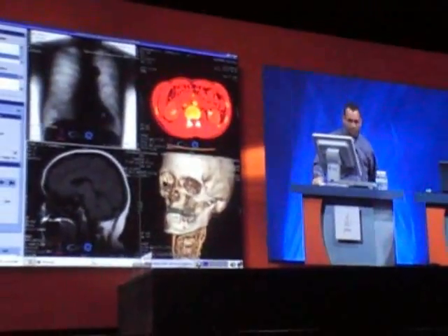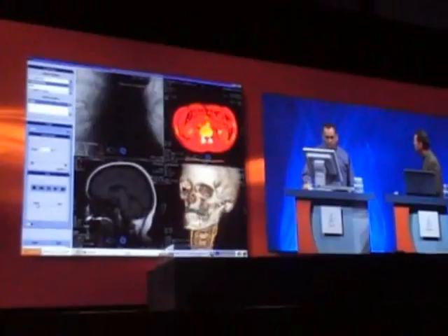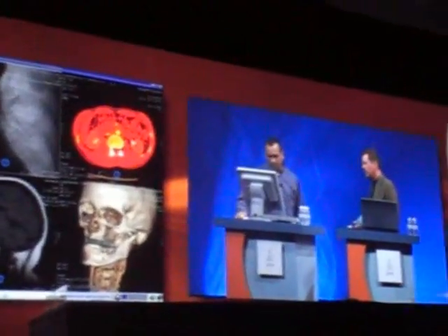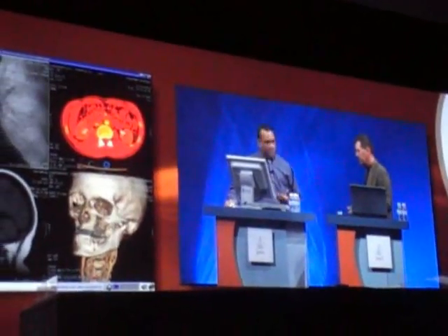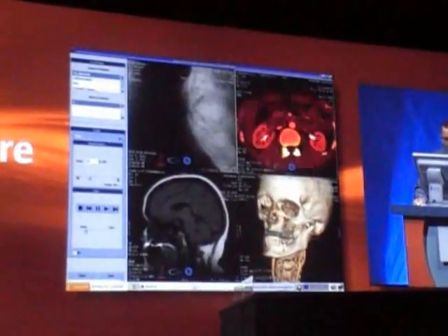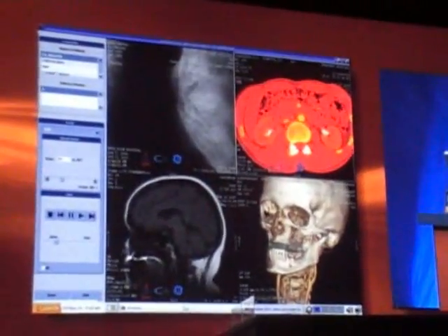They would be doing things like zooming and analyzing lesions, for example, in this chest x-ray image that you see before you, or this abdominal CT scan, and changing things like contrast interactively, and so on and so forth.